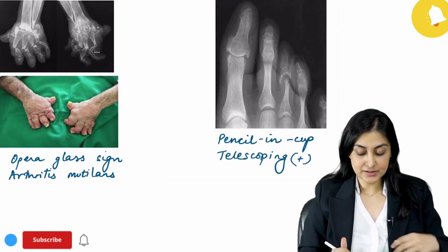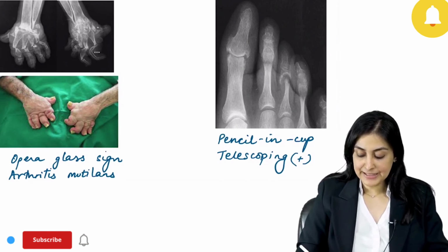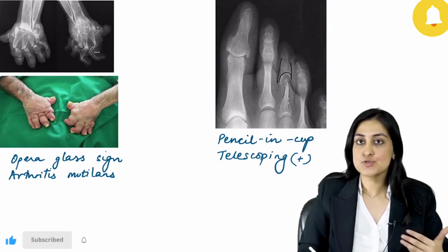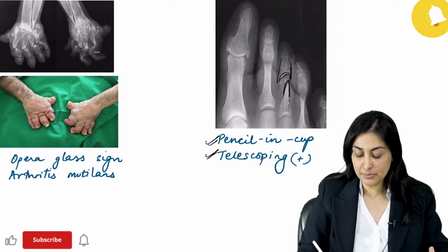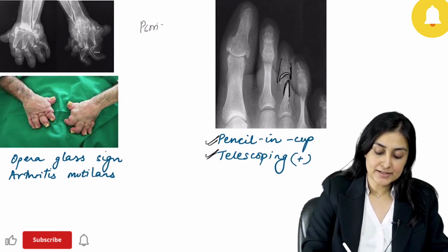The next disease here, what do we find? First of all, let's have a look here. Here we can find that there is this gross destruction of the joint space. Do you see this? That there's this gross destruction such that the bone is telescoping into the bone, right? So there is telescoping at the joint space, also called pencil in cup. So it looks like this tapered pencil within a cup, and both of these are hallmarks of psoriatic arthritis.